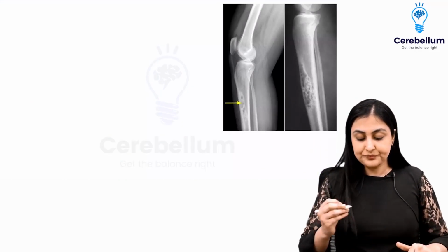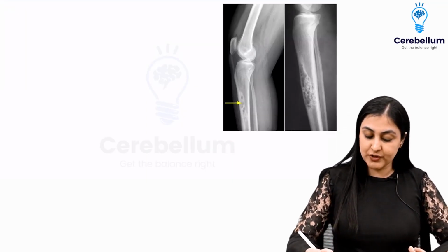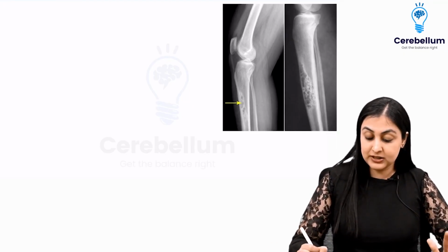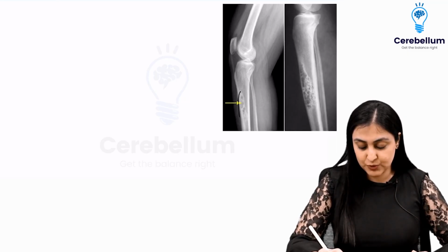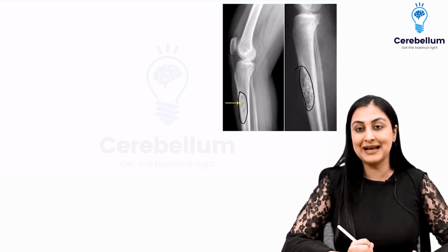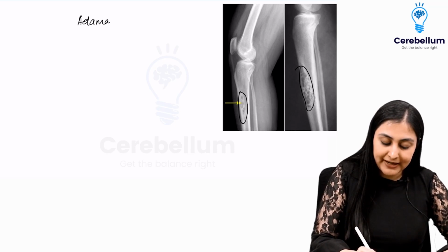Okay. Now, the third diaphyseal tumor, here you just want to remember that this is very specific to tibia. Only when the tibial bone is shown to you, you want to think of this, and this is something which is a very eccentric sort of lesion. It is much more anterior, alright. So, this is an eccentrically based anterolateral lesion on the tibia. You want to think of adamantinoma.